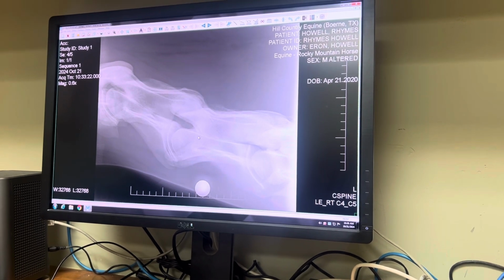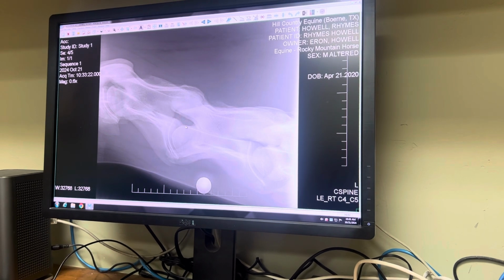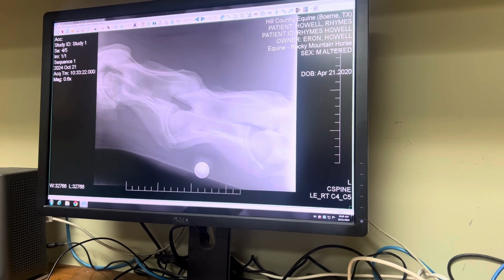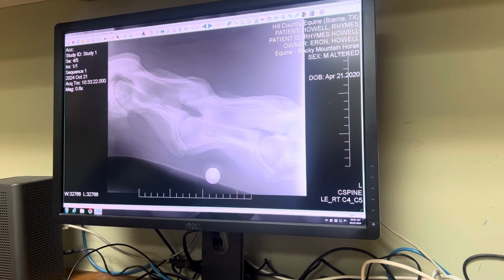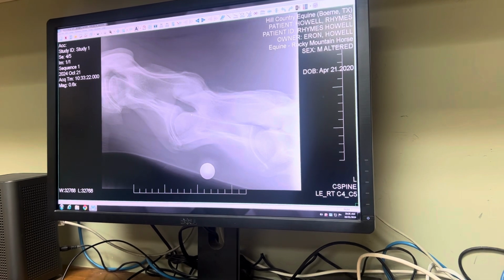This is the normal one where they should be at a plane, and you can see that, and we're not going to even measure it because it's got no purpose, but there's what they call sagittal ratios. So this should be opened up about twice as much as what it is. As you go down the vertebral column, your sagittal ratios actually get smaller and smaller as you go.